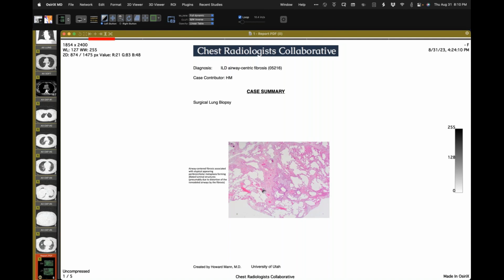And here you can see there's some airways here. I'll make this even bigger. And these relatively deep staining cells here are respiratory epithelium. So looking for a normal bronchus, I don't see one here in the companion artery, but we're in the central portion of the pulmonary lobule. So this is sort of an airway-centered fibrosis.